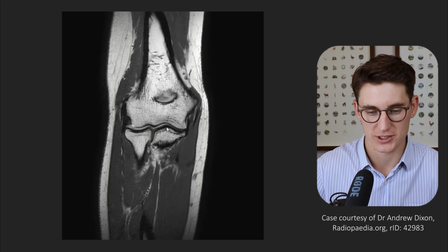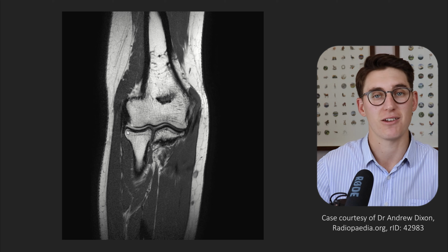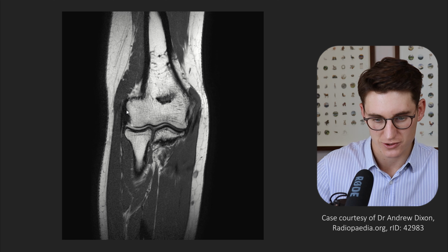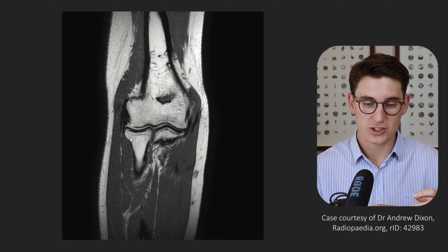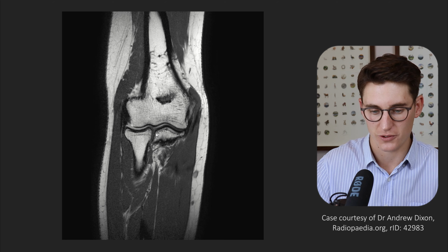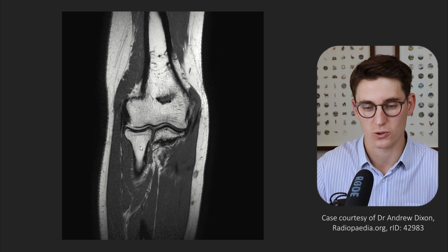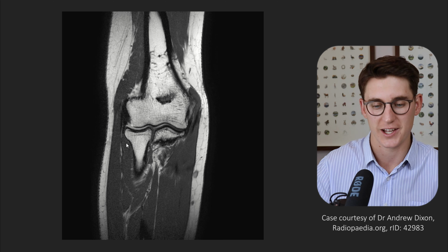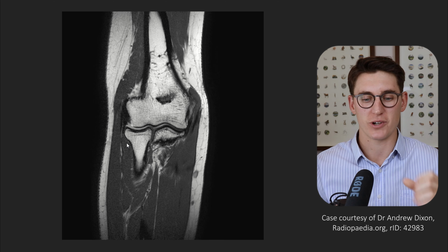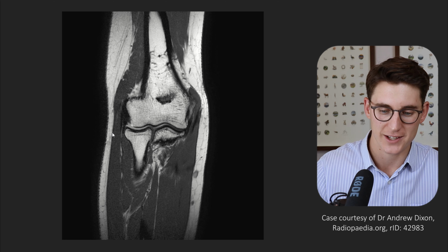Let's head on to our lateral ligaments here. We can see our common extensor tendon here separated from this band here, which is our radial collateral ligament, our lateral collateral ligament. Our radial collateral ligament heads off from this lateral epicondyle slightly more medially to this common extensor tendon and inserts into the annular ligament that we talked about in the X-ray radiograph talk that wraps around the head of this radius. And we're going to have a look at axial imaging when we finish off this talk, looking at all the various bits of anatomy, and we'll see that annular ligament wrapping around this radial head, allowing for that pivot motion while keeping that radial head in place. So we've got our radial collateral ligament that then inserts into our annular ligament.